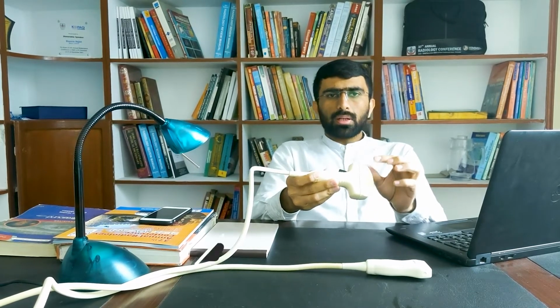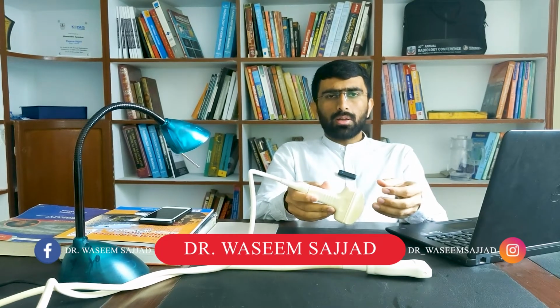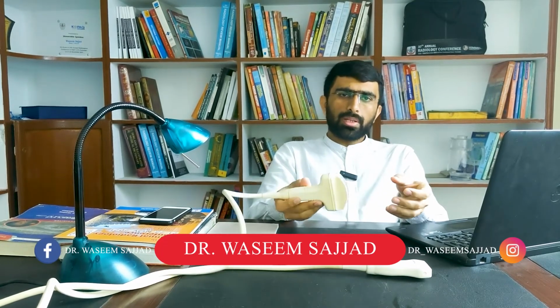This piezoelectric substance is very delicate, so it is very important to handle the probe with care. In case we hit the probe on some hard object or it is dropped by chance, there is a high probability that the piezoelectric crystals will get damaged and it will affect your ultrasound image on the screen.